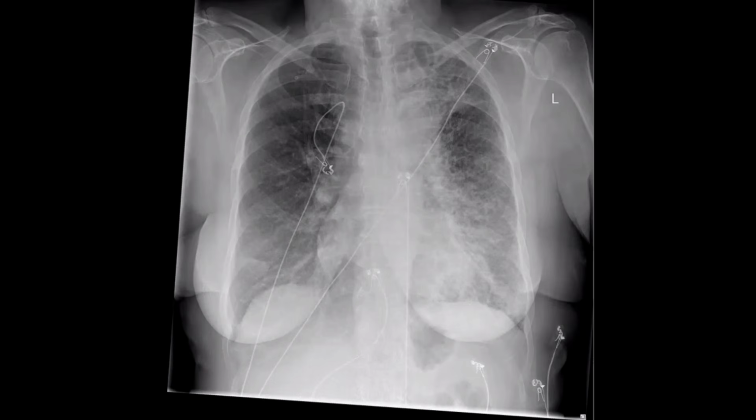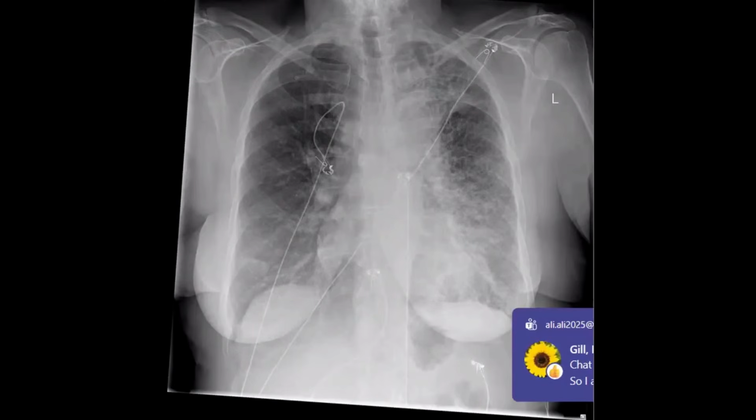It causes veiling of the left heart border. With this, I can also appreciate some air lucency noted within the apex of the left lung, which could be bronchiectatic changes or architectural distortion. Okay. I'm not sure about that. I need to see it. When I look at both costophrenic angles, they appear normal, with no pleural effusion. Just the heart border, as I mentioned, appears veiled on the left side.